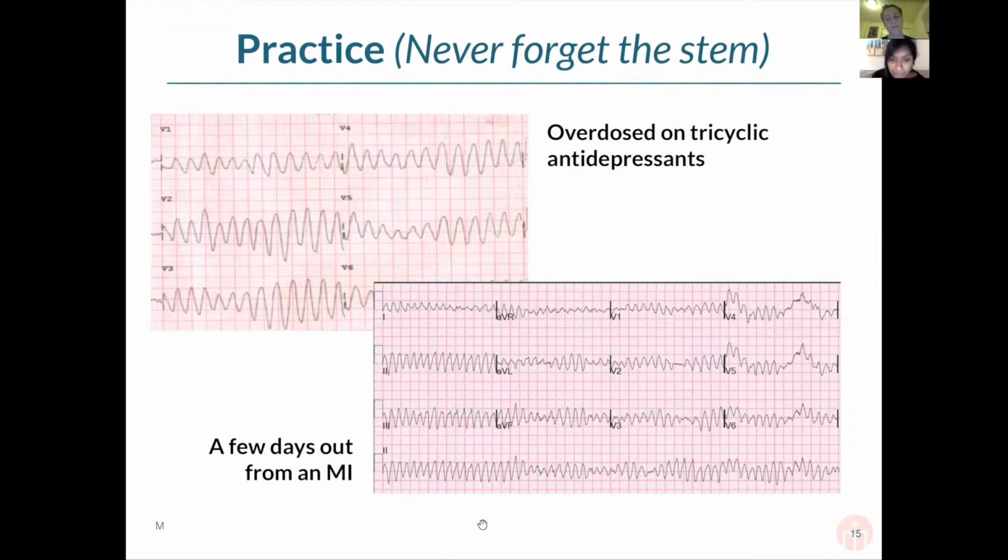But what I really try to look at is aVR, that's the lead that I'm really looking at. That just looks like it's puttering. That doesn't look like any sort of distinguishable activity. It just looks like it's sort of fibrillating, one might say.